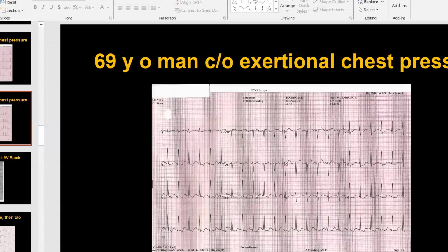So we advise people to not rule out ischemia every time a patient who happens to have paroxysmal AF shows up with AFib, because it's generally not due to ischemia, it's due to the AFib. But when you see those rate-related ST depressions, you shouldn't get too hot and bothered about ischemia, in other words.